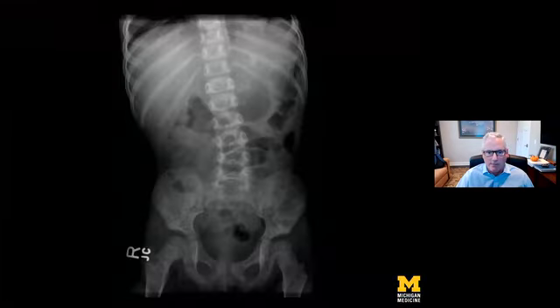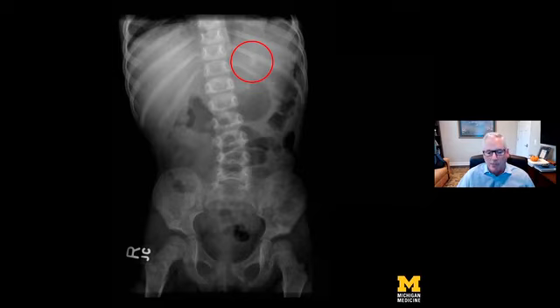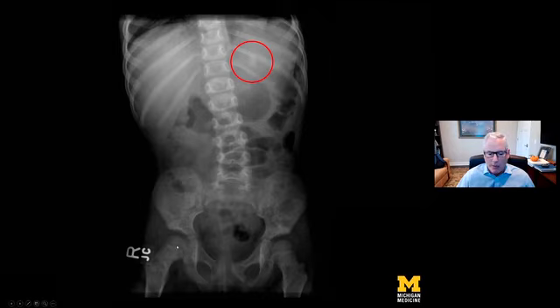So for example, we look at this radiograph, and I already see a couple of things that make me concerned. Number one would be that calcification in the left upper quadrant. I can see sort of clump-like calcification. The other thing is the appearance of the bony structures. If you look at the iliac wings and the proximal femurs, and even the ischia, we are very patchy and mottled. There are some lucent areas that are concerning for bony metastatic disease. We may even have some loss of height of this vertebral body.